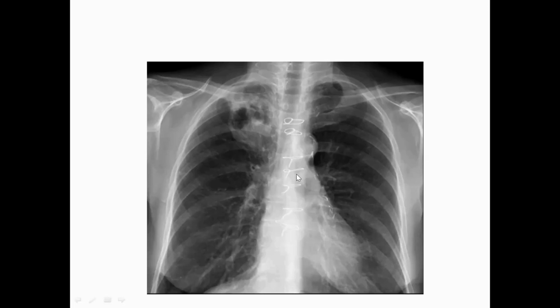And this patient has undergone surgery, a CABG, bypass graft surgery, and that's why you can see the sternal wires and clips. This is clips and wires, okay? Otherwise, to be honest, the left cardiac border can easily be outlined. There is no obliteration, and this is the right cardiac border. There's no obliteration. This is the right diaphragm, and we can see the left diaphragm and costophrenic angles.